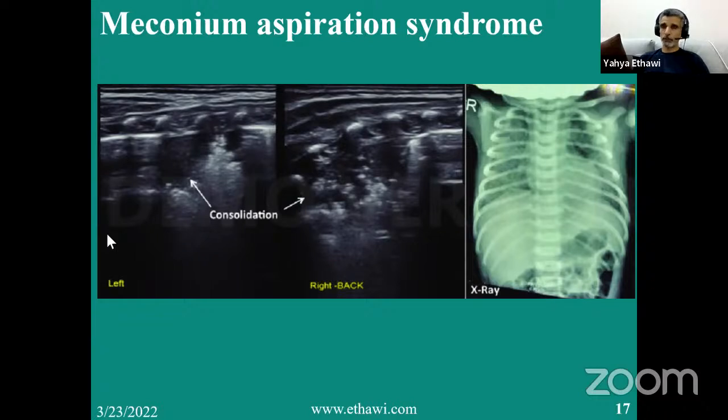Of course, you will see the baby with a history, and most pneumonia is either lobar or translobar. They don't go like in this diffuse pattern, normal, abnormal, normal, abnormal. So either you see a local area of normality, so that you can differentiate pneumonia. You can also differentiate from pulmonary hemorrhage, as we will see later when we discuss cases.